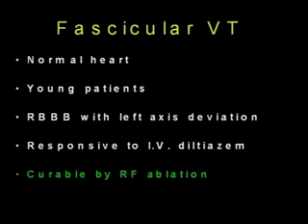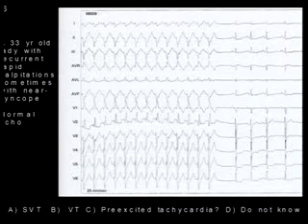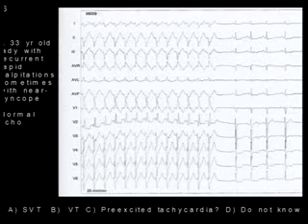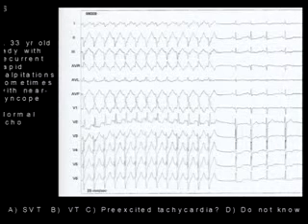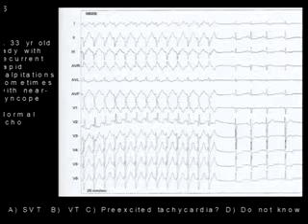Again, this is not heart block. And it is sometimes not so easy to see, but you have to look for it. I think the important thing is these patients are misdiagnosed as sick sinus syndrome. And sometimes with some symptoms like giddiness, some even go for unnecessary pacemaker implantations. So the important thing is if you recognize it, you know it's benign. So don't fall into this trap. I'm sure Narasimhan, Sriram, you must have seen patients referred for a pacemaker or worse, having already undergone a pacemaker for blocked PACs.